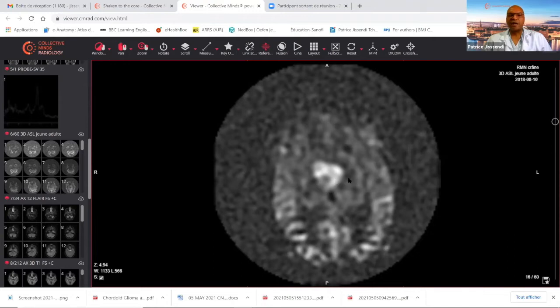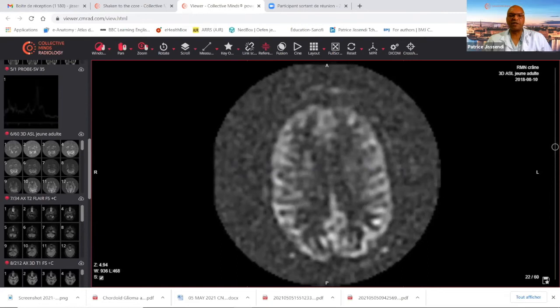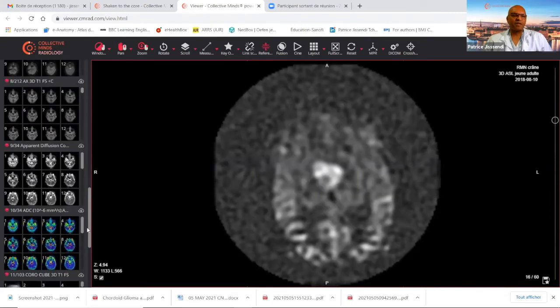And looking at the fused image that I sent before, what is interesting to notice is that only some part of the tumor shows an increased CBF. So the vascularization of the tumor is not homogeneous, but heterogeneous. And this is an information to keep in mind.